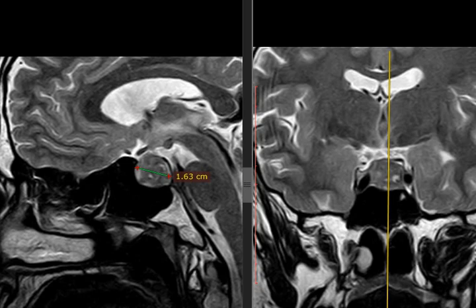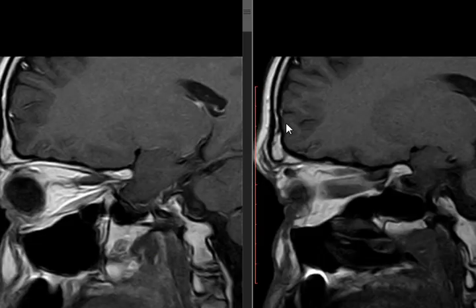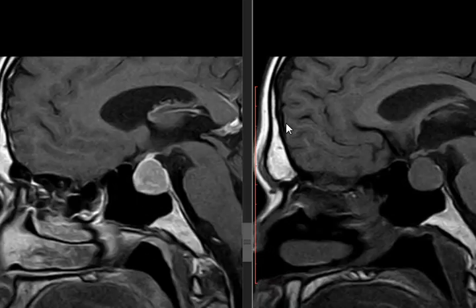This is post contrast, and I think this is pre contrast. What does it look like? Enhancing or non-enhancing? So it's showing enhancement. And what is this? This is a dural tail, so it's a meningioma. Do you agree, guys? Hello, Doctor, peace be upon you.